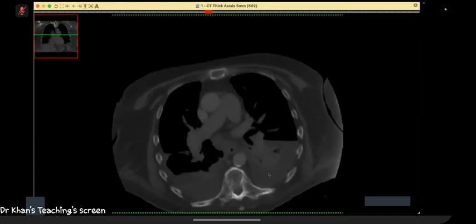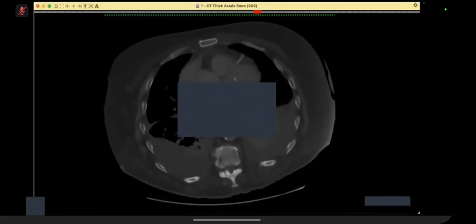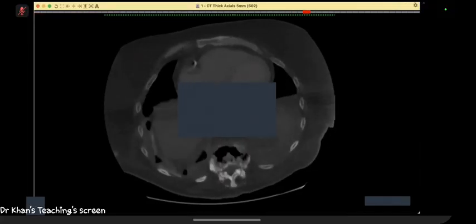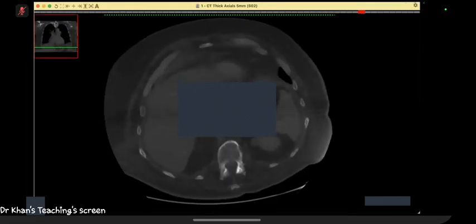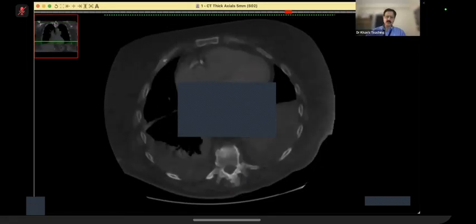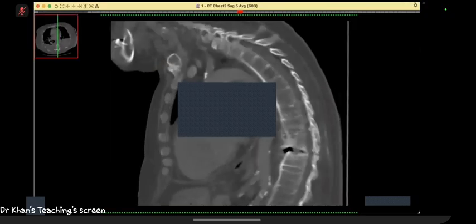So ankylosis with a kyphotic deformity could be a case of ankylosing spondylitis, but I do not see any calcification of the anterior longitudinal ligament. Or these could be lytic. Especially this vertebra looks like there is lysis involved with adjacent bony fragments. What do you think is happening before I show you the sagittal, which you asked for? I think that there is bony ankylosis with probably an osteoporotic fracture, or this could also be a pathological fracture.